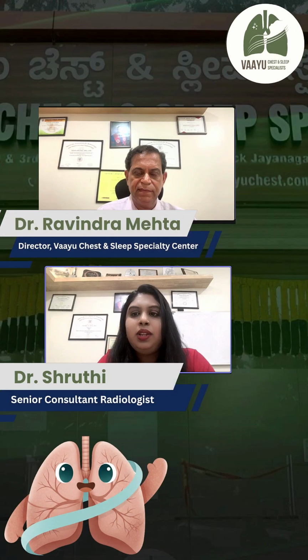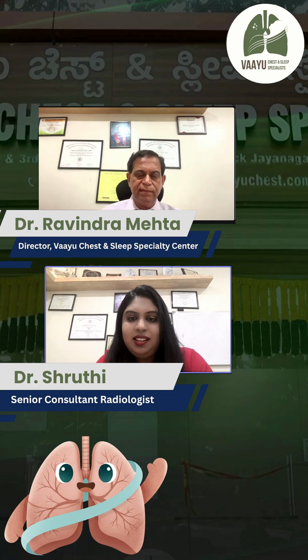Actually, there is quite limited data comparing the CT findings of all these organisms to differentiate between aspergillosis and mucormycosis. Very few of the recent data actually suggest that the reverse halo sign and pleural effusion go more in favor of mucormycosis rather than aspergillosis. The radiological findings should always be interpreted considering the host risk factors. This is where radiology and pulmonology can truly intersect, with some of the imaging features guiding clinical diagnosis. But ultimately, histopathology will be the king.